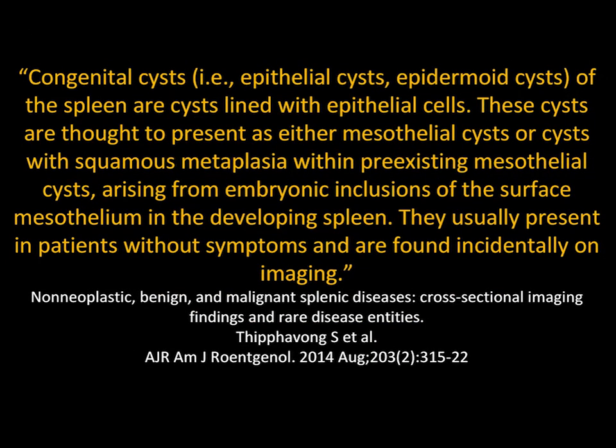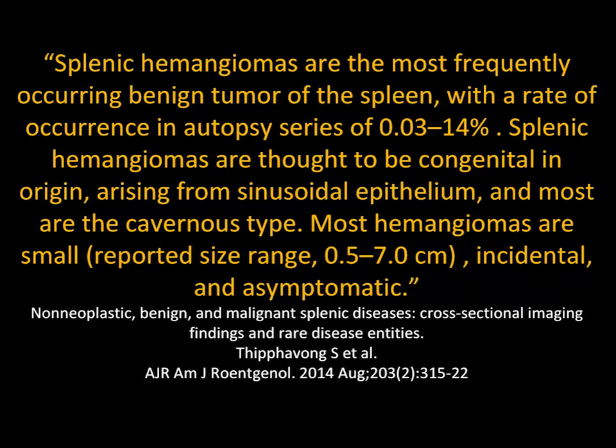Now, one of the more common things, congenital cysts. Water density, they can be large. At times they have to be resected because they cause mass effect on the stomach. Usually it's an incidental finding and it's a leave-alone lesion.